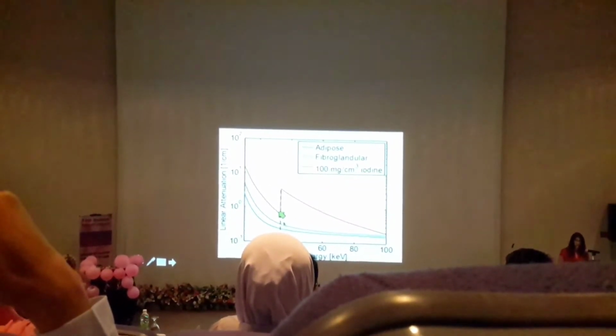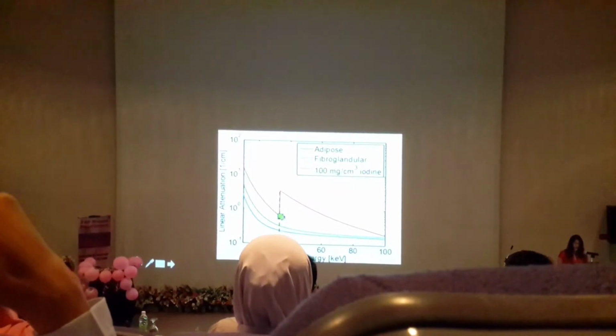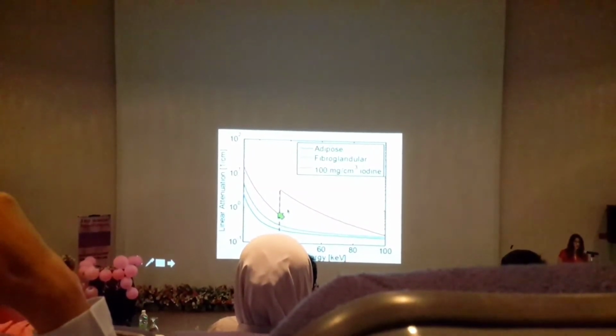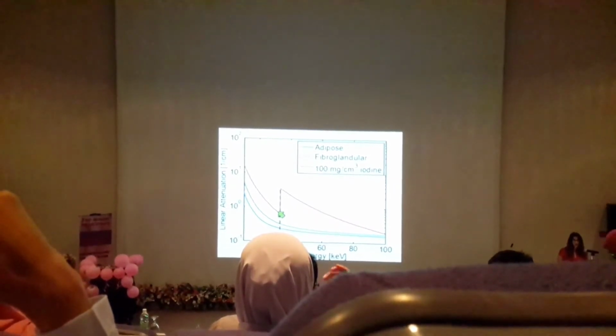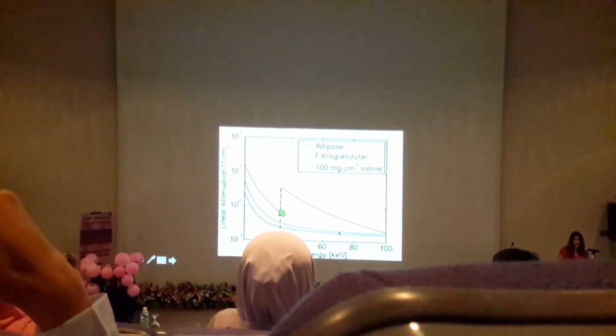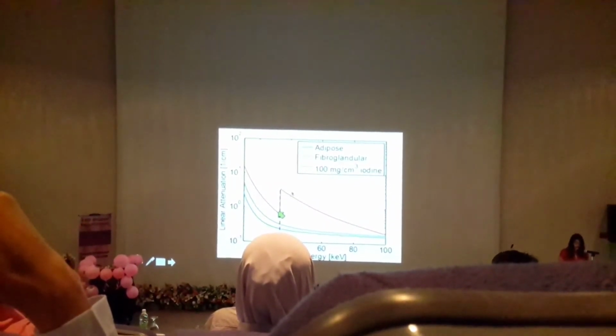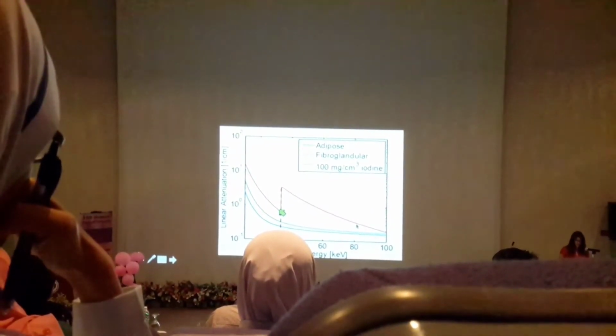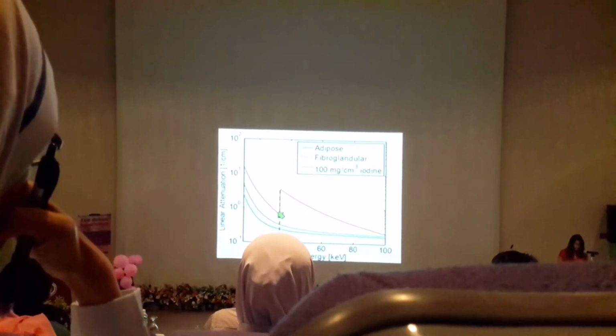Then it reaches 33 keV, where the attenuation of iodine dramatically increases. That is the whole concept of contrasted imaging in radiology. So it dramatically increases, and above this level, the iodine content is very high, and you get basically an iodinated image, and the breast tissue is very little in the images after that. All right, you hardly see much of the breast tissue.